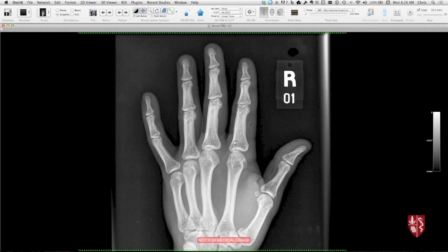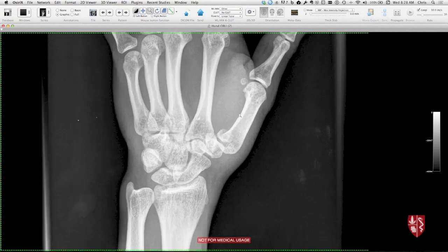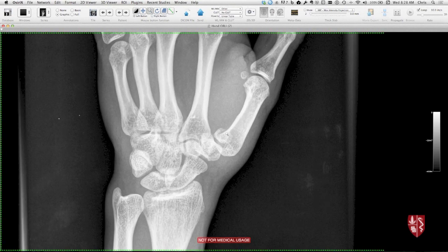Oh, so yeah, sorry, I was jumping in. This is a different patient, or this may be that same patient's whole hand with that Bennett fracture here. So fracture at the base of the first metacarpal, and then look for how much subluxation there is of the first metacarpal base on the trapezium. Normally there's some flexibility there, and people can usually sublux somewhat, so it's hard to know how to interpret that, but it's good to look for that as well.